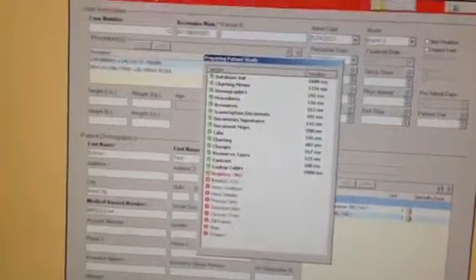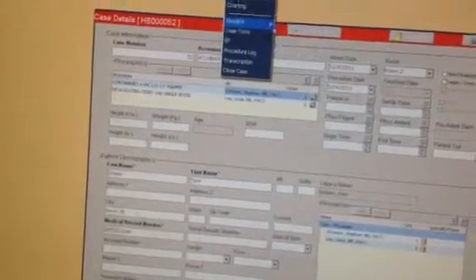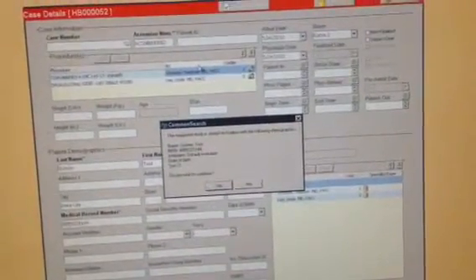And then as that loads up, you'll go to images just like you normally would any other procedure, so that Dr. Lee can pick her before and after pictures. Now it's important that Dr. Schomer picks 4 images, or whoever the diagnostic doctor is picks 4 images, because the interventional transcription will start with image number 5.